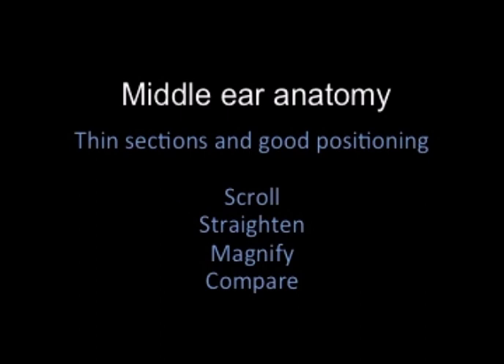You need to have decent CT. So if you've got a standard CT head with thick sections, no good. Thin sections of the temporal bone, you'll probably find that, like in my department, you have radiographers who rotate, so your positioning is often not perfect in any plane, to be honest.